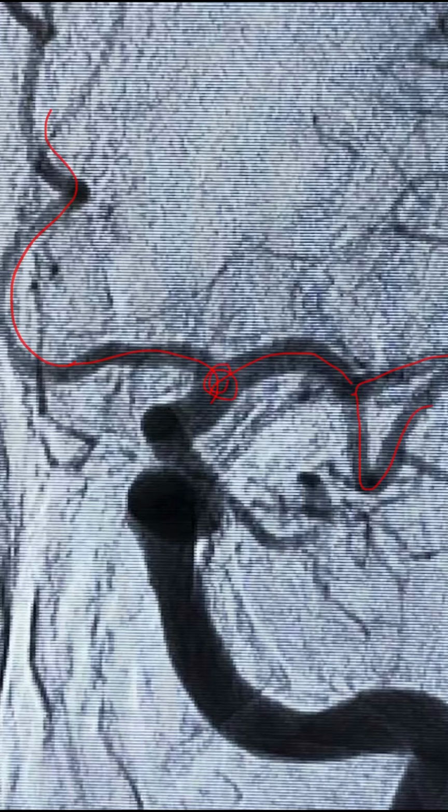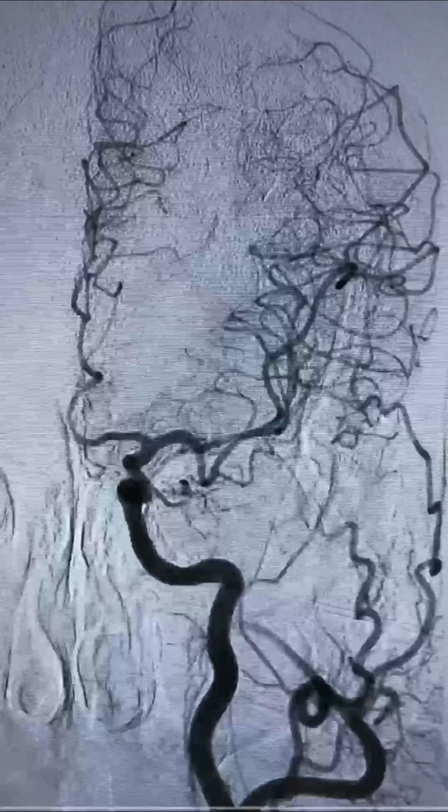Clear? So suppose there is a thrombus here, extending here and here, then we call it a T-occlusion. This is what a T-occlusion is. Many a time people say that the patient has got a T-occlusion. T-occlusion means the distal internal carotid artery is occluded, including the ACA, A1 and the M1. Clear? So what else do you see?